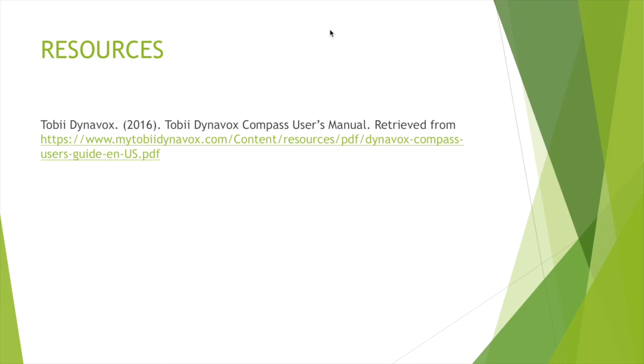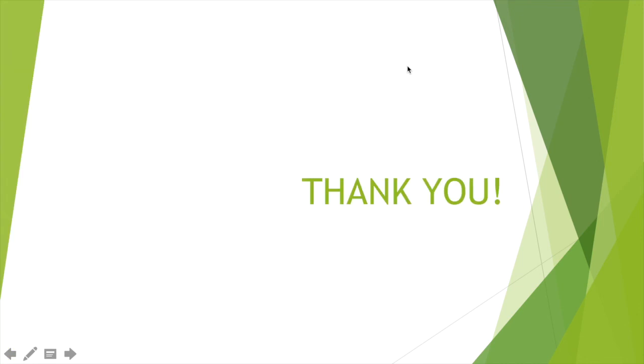Thank you for joining me today to review the Tobii Dynavox Compass application. The application offers so many page sets, so much information, and so many settings that it's impossible to cover in one review or demonstration. I look forward to learning more about this application and trialing it with a variety of individuals I work with. Thank you.